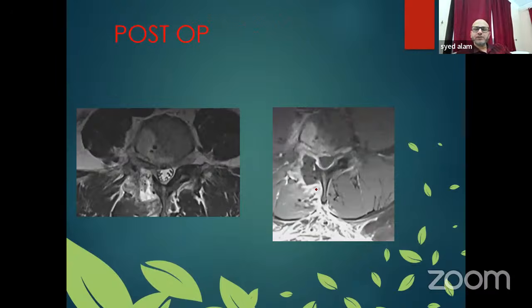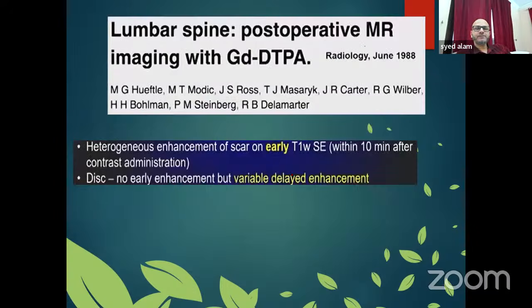So again, same thing. Here this track is on the right side. So these changes are post-op changes, not infection. It's a normal finding in post-op conditions.